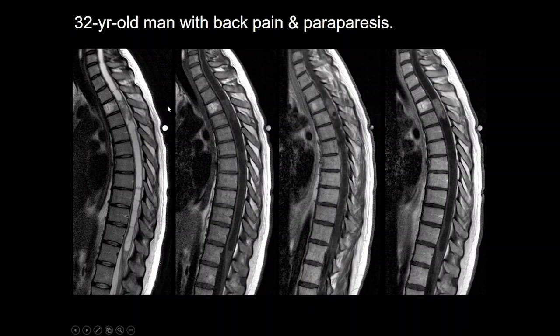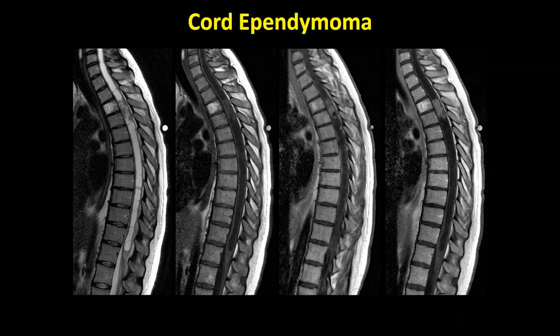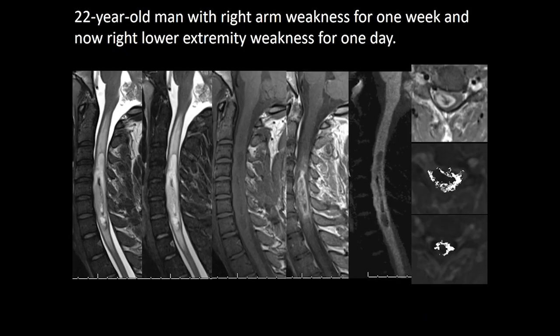Having said that, notice the age of this patient. This is not a pediatric patient. This is a middle-aged patient. Diagnosis, therefore, will be that of a cord ependymoma. Again, remember this, friends. It is the age that trumps the diagnosis when you try to differentiate the two. Pediatric patient, consider cord astrocytoma. A middle-aged patient, expansile heterogeneous lesion, you favor the diagnosis of a cord ependymoma.